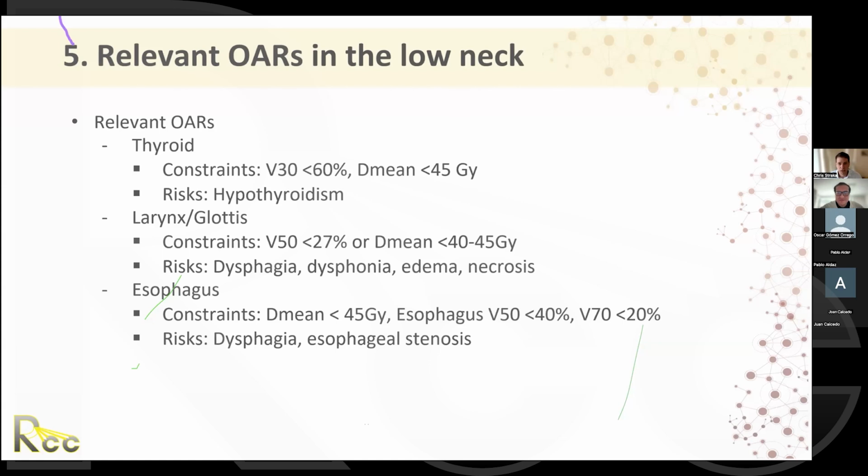I push really hard on it. If there's a couple of pixels or something that's over, because there's just gross disease basically abutting the brainstem, then I will take the very surface of it. But I'll certainly push as hard as I possibly can on that to not have to cool it off as soon as we get below the surface of the brainstem. Thank you. Great question.